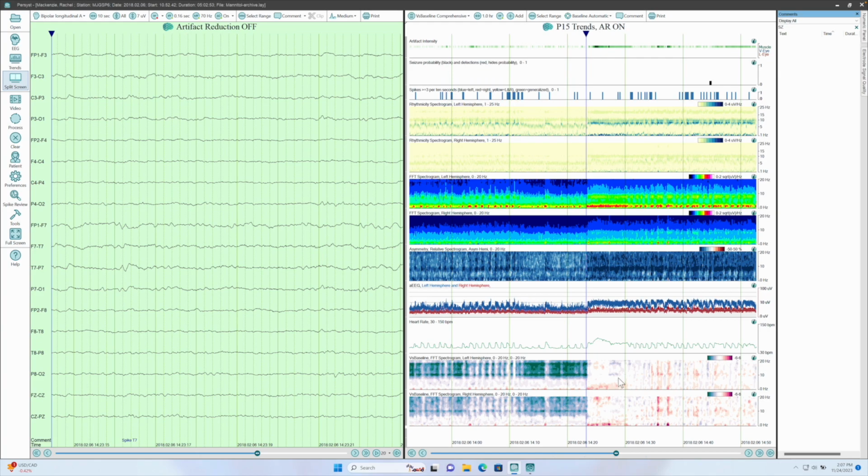This supports the hypothesis that the worsening state was related to increasing intracranial pressure. The heart rate oscillating with brain function could also be related. The versus baseline trend can support recognition of important changes that may happen slowly over time and be difficult to recognize.